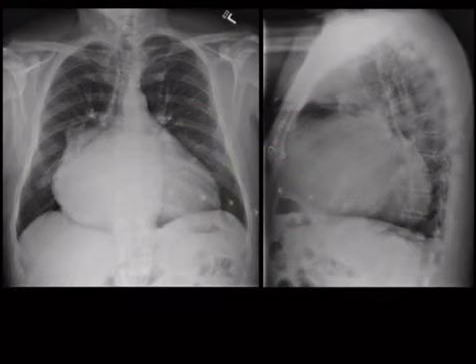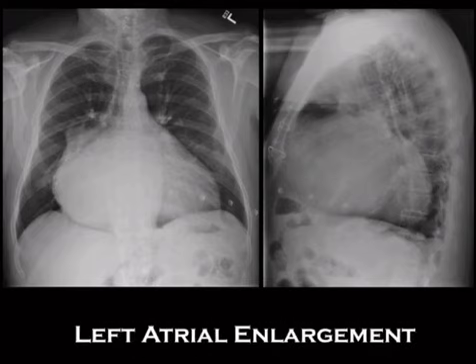There's another cardiac case. This is your classic. It's just got all the findings. So left atrial enlargement. 3 main findings you need to know. Can be shown 3 main ways. The one is you can show this double density sign here. You may say, hey, that's the right side of the heart, but that left atrium is the reason you're getting a double density like that.